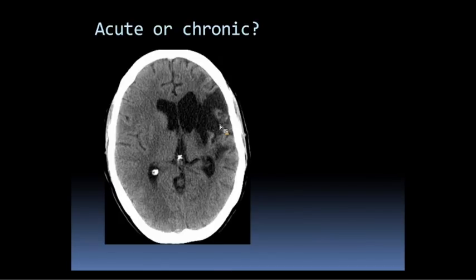Shift? Yeah, no shift, but you may not have shift even in an acute infarct. You might not get there yet, or it just may be small. But along those lines, you have actually volume loss. You have the opposite, right? So you have dilatation of this ventricle here, and this is the normal ventricle shape. You have the caudate here, and so here, because of adjacent volume loss, we call this ex vacuo dilatation. So essentially, dilatation due to volume loss in the adjacent parenchyma. So if you have evidence of volume loss, you know that you're in the chronic phase.